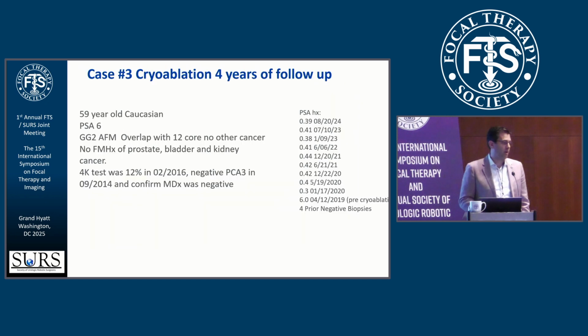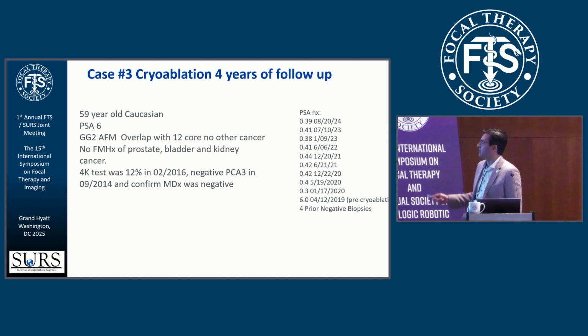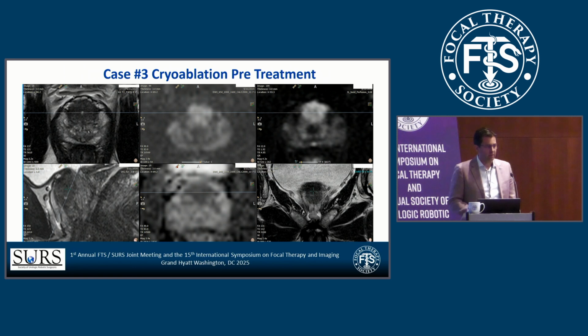Another case, this is a cryoablation. This patient has 4 years follow-up. He had 4 prior negative biopsies before we diagnosed him. His PSA was 6. Post-treatment, this has been his PSA trend for the last 4 years. The lesion, does everyone see the lesion? Anyone? Yes, Dr. Cianti is making some hand gestures.